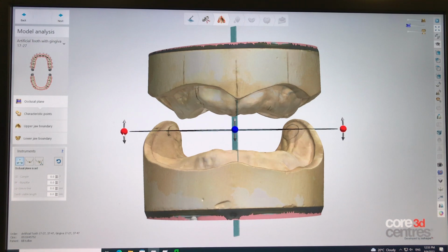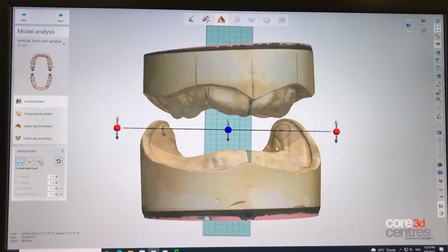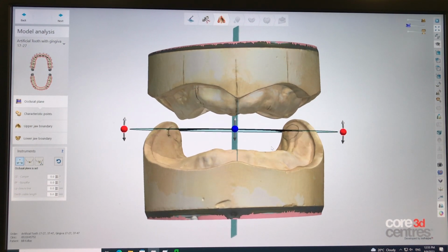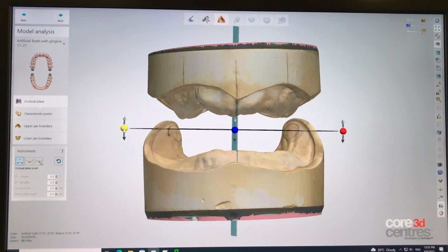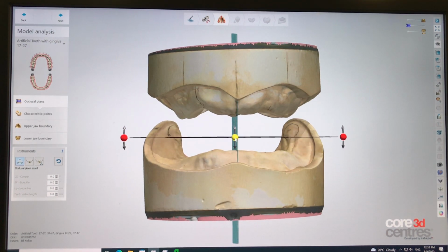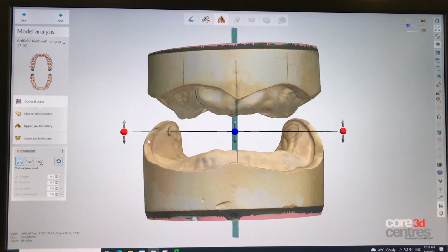Okay? Where do I want to change it to? Well, by having those marks on my retromolar pads, they certainly help now. They can serve me as a guide. So I'm going to tilt this a little bit and bring this down. So I can move it up or down, but you can't vary too much here. You can make some corrections, but if you have to make a big correction, you have to go back and question what you did chair side. So once again, the system is only as good as whatever you put into it.